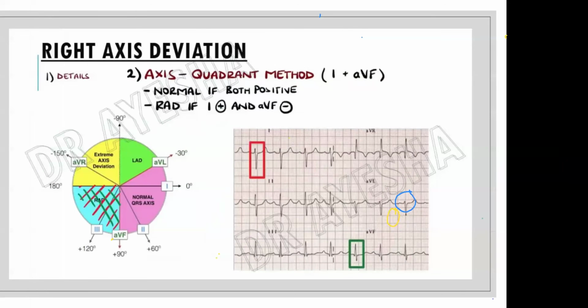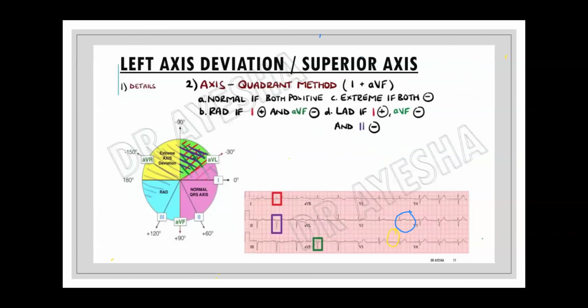Okay. Now, next, left axis. So what about the left axis? I'll give you the practice as well. Okay. So just the left axis, first what I told you, for left axis and normal axis. Now the problem arises. What problem arises, doctor, in this session?